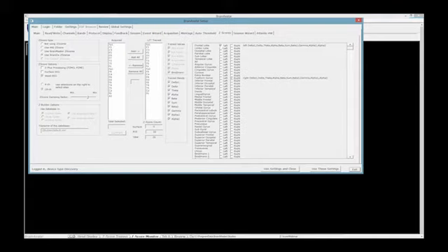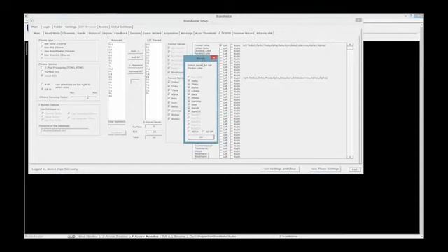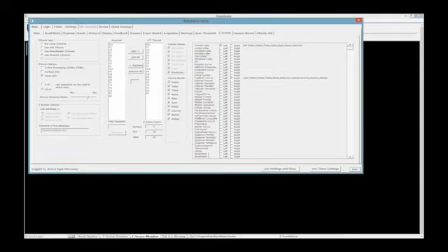Now, I want you to notice right off the bat that ROI is showing 20 total right now because I'm doing one right ROI and one left ROI, and I'm doing all 10 bands. But watch when I right-click on here, I'm going to bring up this menu. And this menu is going to allow me to deselect different bands that I may or may not want to train. So now I've deselected 3 bands, and now you're going to notice my ROI is down 3 bands as well.